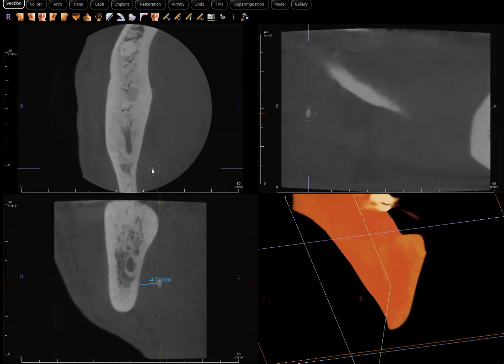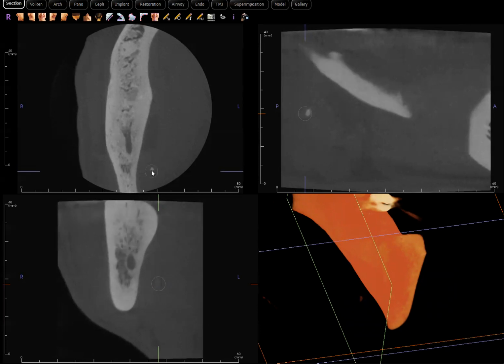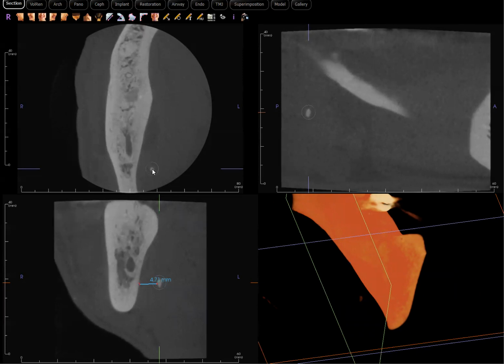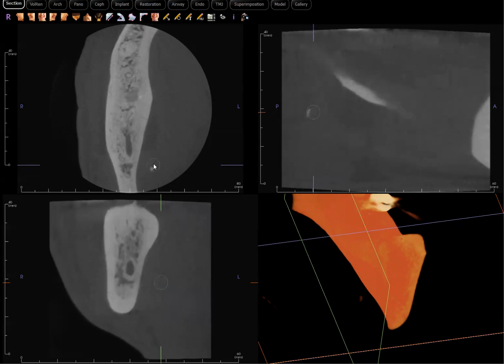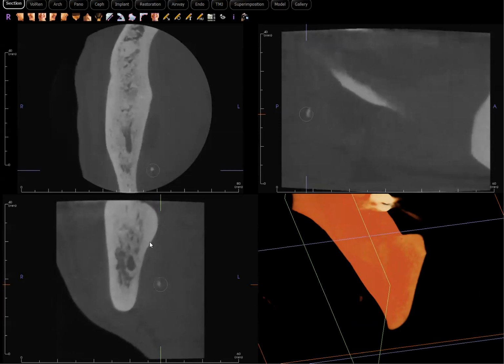Well, in order for me to answer that, we have to have a better understanding of anatomic structures. Also, keep in mind that CBCT does not have good spatial contrast or resolution for soft tissues. So it's very difficult to make out which tissue we're looking at here. And that's where your gross anatomy knowledge comes in. Based on the location, I would presume that we're in the area of the submandibular gland. And so when you see a calcification in the submandibular gland, I'm thinking of a sialolith.